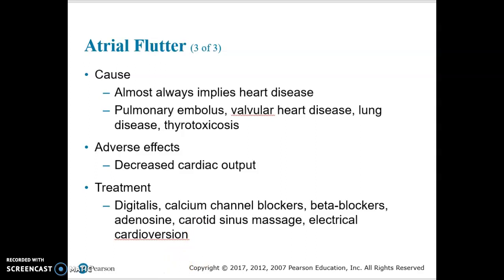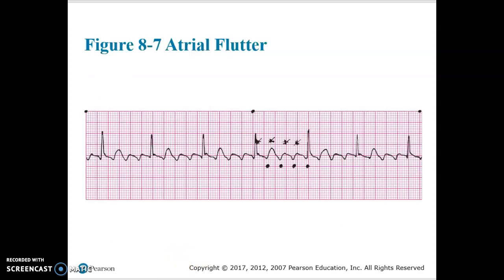So now I'm going to move down and we're going to go through a strip here. Don't become overwhelmed when we look at this strip. Remember, we've got to work through those 5 questions. I've seen in the past that when people look at a strip and it's not the typical strip, they automatically panic and say, oh my God, I don't know what this is. Well, you can't figure it out unless you go through the 5 questions of how to interpret that strip.